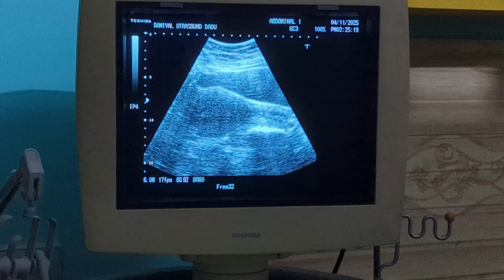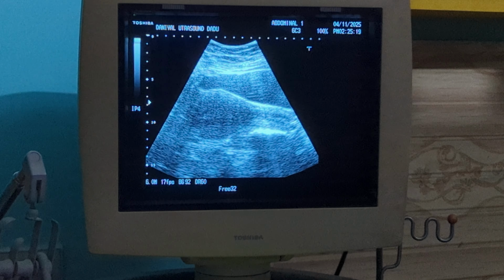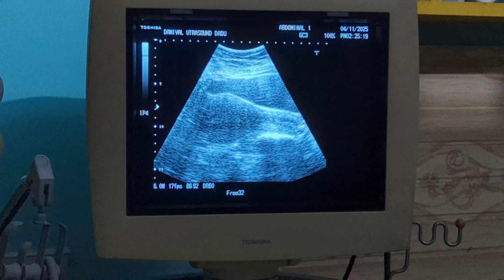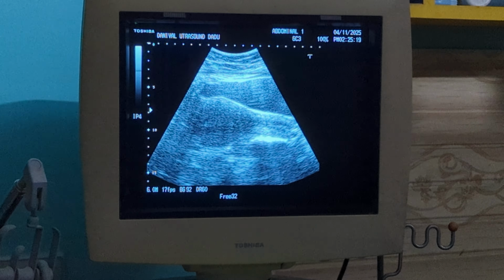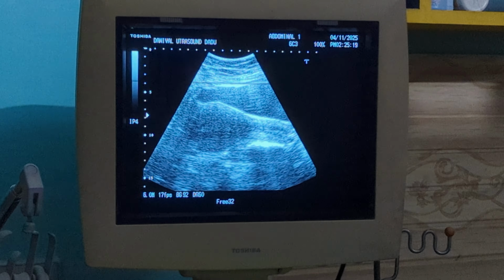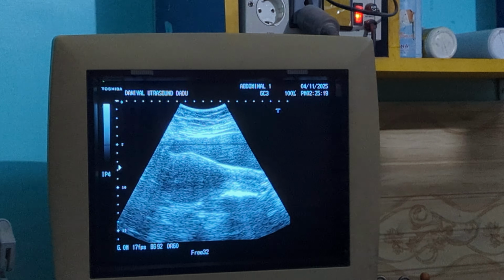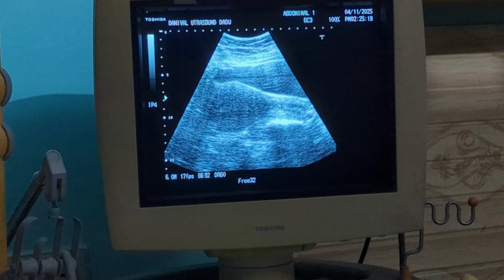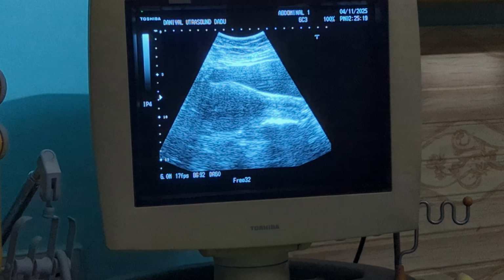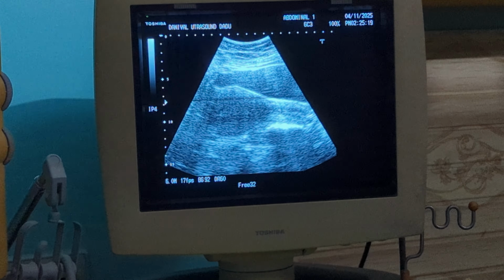So clinically, adenomyosis causes diffuse pain and heavy bleeding, whereas fibroids may cause pressure symptoms or focal mass effect. Now, friends, when you see an enlarged heterogeneous uterus with a poorly defined junctional zone and tiny cystic spaces in the myometrium, always keep adenomyosis at the top of your differential diagnosis.